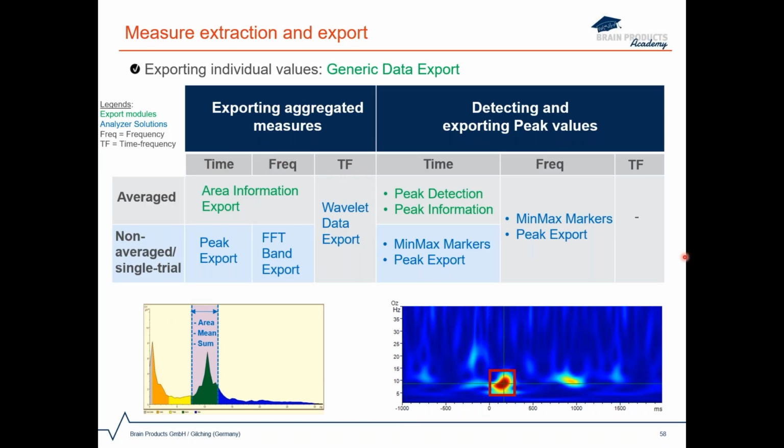Note that the options shown in green are the Analyzer export options, and you can find them in the Export tab in Analyzer, while the options highlighted in blue are the solutions. They are part of the All Analyzer Solution package. If you don't have it yet, you may download it from our website.